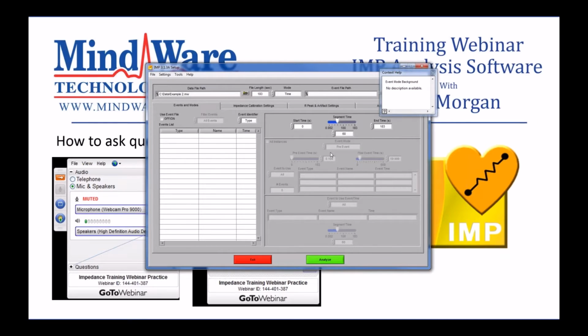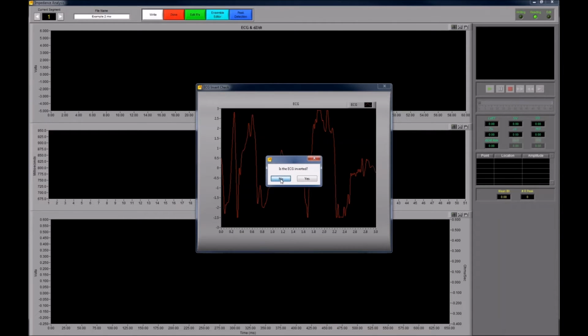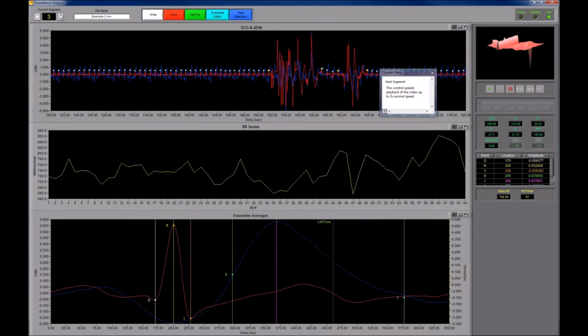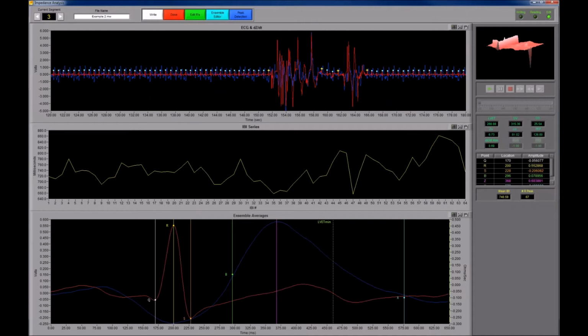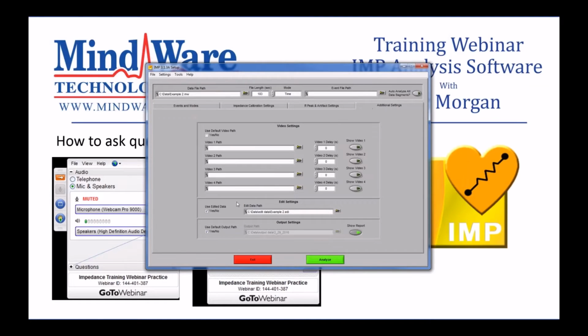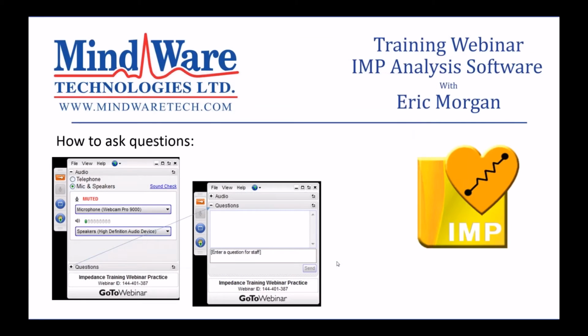Okay, so there's another question about the peak detection settings, and related to when I changed them so that it only found peaks that were above 0.5 volts. What I did here, and I did this off screen, so I apologize for that. What you would do in this situation, and I'm going to go ahead and undo these edits so we can do it from scratch, okay.